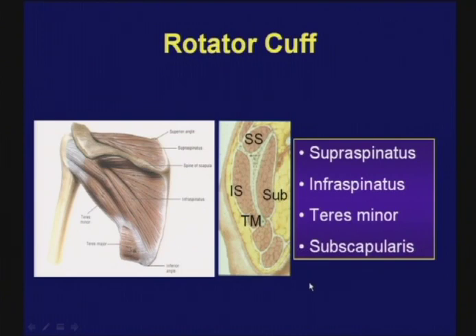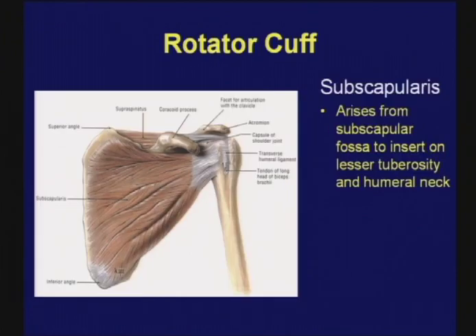So if you're having trouble deciding what tendons you are looking at laterally as you get to the tuberosities, go back medially in the sagittal plane, identify the muscles, and then follow them on sequential sagittal images as you extend toward the greater tuberosity. This is the appearance from the anterior aspect.